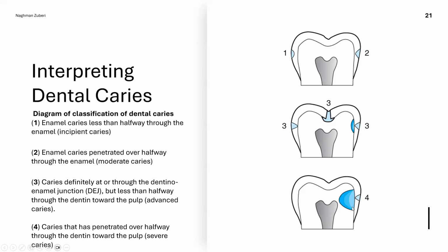The occlusal caries also acquire the shape of a triangle when they start in the enamel in the pits and fissure area, but the apex will be towards the occlusal surface or towards the outer surface, and the base will be towards the dentino-enamel junction. But when they cross the dentino-enamel junction, firstly the caries progress along the dentino-enamel junction, and then they acquire the shape of another triangle whose base will be towards the dentino-enamel junction and apex will be towards the pulp.